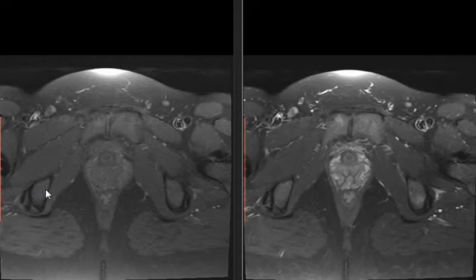So, is it benign or malignant? This is the question. Seems benign. Yes, although it's infiltrative, also it's a large mass. I don't know the duration. If it has not been there for a long while, it's benign. Okay. Like what?